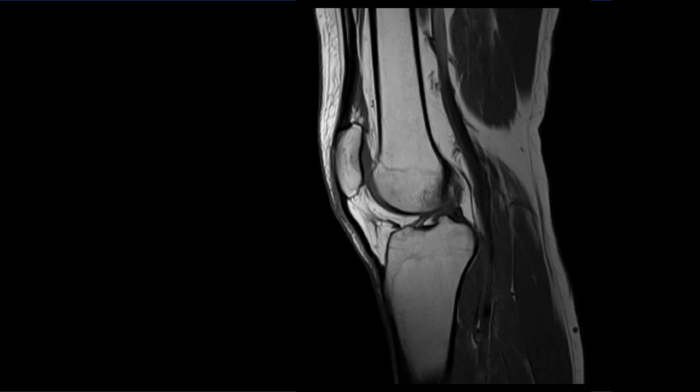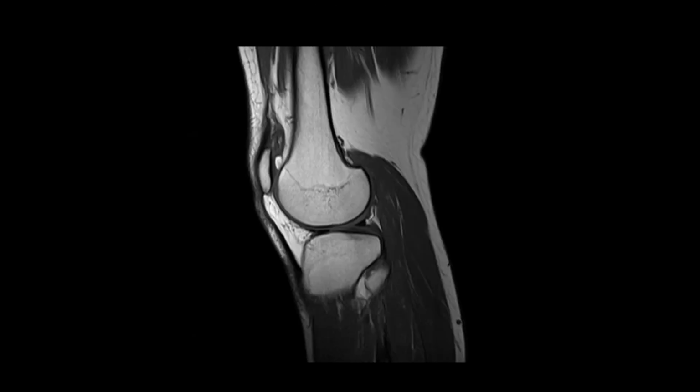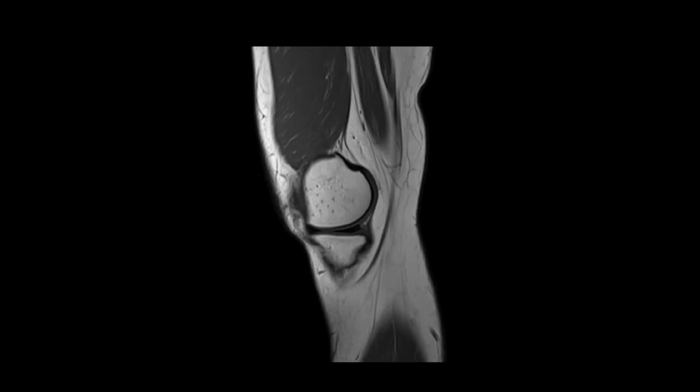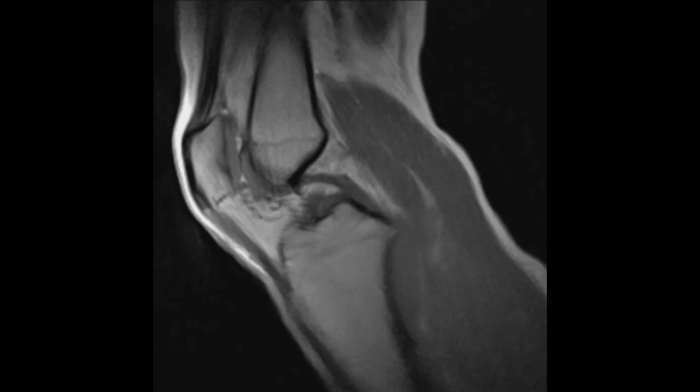This is an MRI of the knee with a sagittal slice through the middle of the knee. We can see much more detail, including soft tissue structures. Here is the same knee but looking at many sagittal slices, starting on the outside of the knee and moving towards the inside. This is a real-time MRI showing a knee bending and straightening.